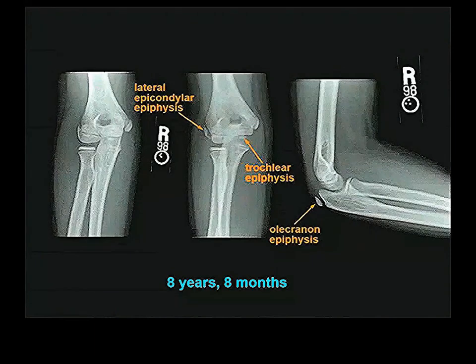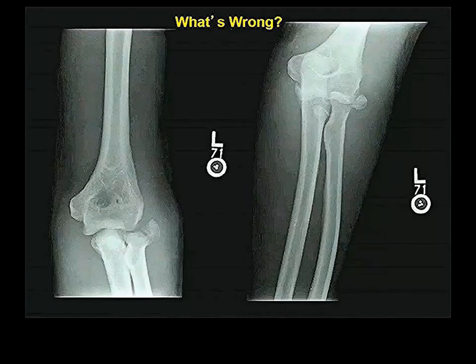Later yet, a nice proximal epiphysis. The radius is quite big. You can also see clearly at this angle the epiphysis for the lateral epicondyle, and there's a little epiphysis, you can see it better here, for the olecranon process. So these are all epiphyses around the elbow joint.